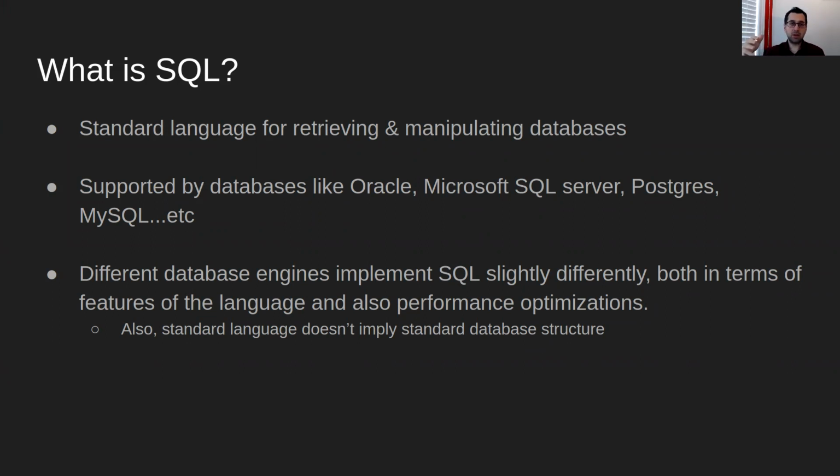In the example we're going to walk through today, you're going to see that my database has a table for study that stores the actual studies, and a table for series that stores the series within a study. The one product I used, which is open source, uses this format, but not necessarily all products use that. In fact, the product I use in this presentation is DCM4CHEE, the old one, not the new one. Whereas I know other products, for example, like Orthanc, use a totally different database structure that's a lot harder to read.